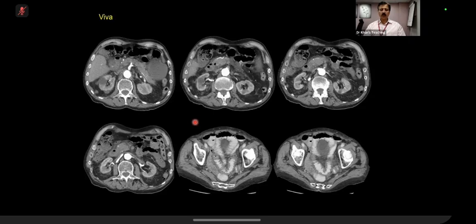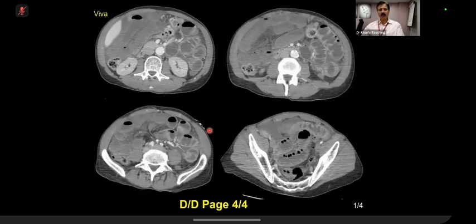So you have done well where you pick up if the bowel is dilated, number one, if there is thickening, if there is pneumatosis, if there is perforation, and in that category, what will be your pertinent negatives or positives? So some of them you have already pointed out. What is left now? Okay, so there's thrombus in the SMA. Excellent, well done. So always look for the big vessels and particularly the SMA. So you can see that there is complete occlusion of the SMA. What is the finding? Ischemic bowel again.